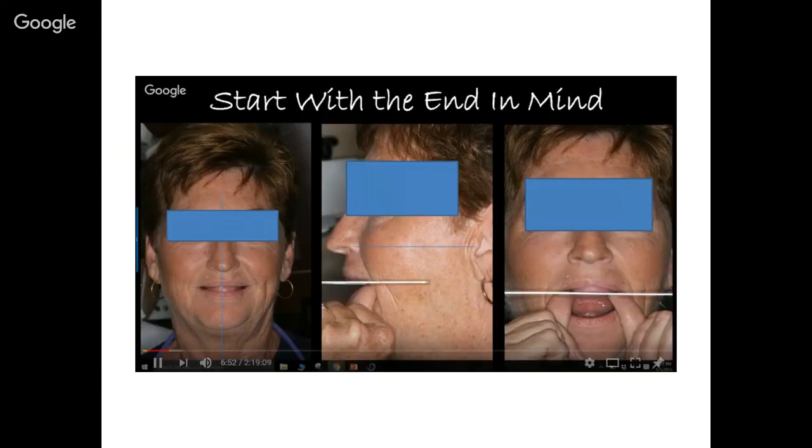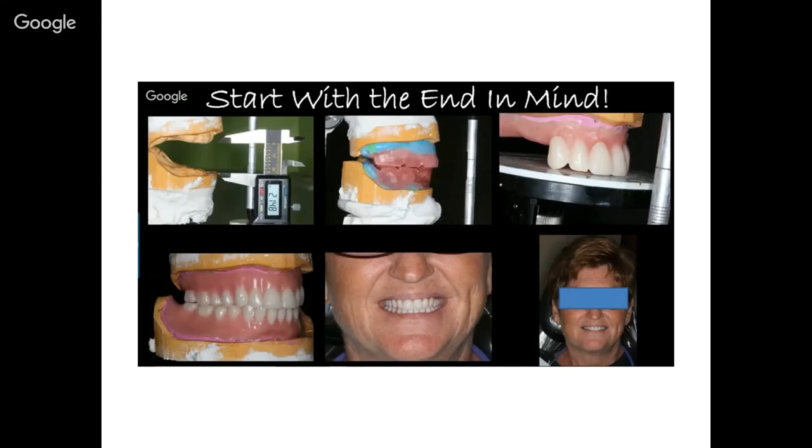So in order to properly treatment plan, we need to start with the creation of a proper denture to show us the ideal restorative endpoint. And here we see the process flow of the patient going through the steps of having a denture created by the lab with the proper phonetics, proper incisal edge position, proper facial plane, and we need to carry this through to create an actual denture.